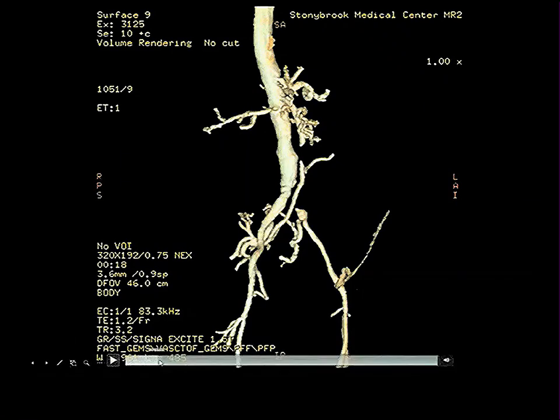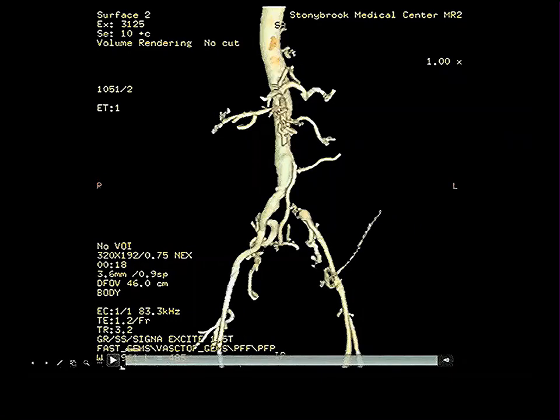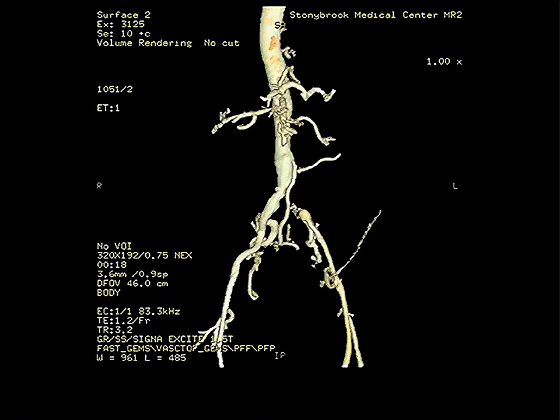Now, there's an artery we see here, right here, that you normally never see in these things. And it looks to me like it's coming off of the left external iliac. So what do you think that artery is that we don't see on the right side at all, obviously? There's only two branches of the external iliac. This is one of them.